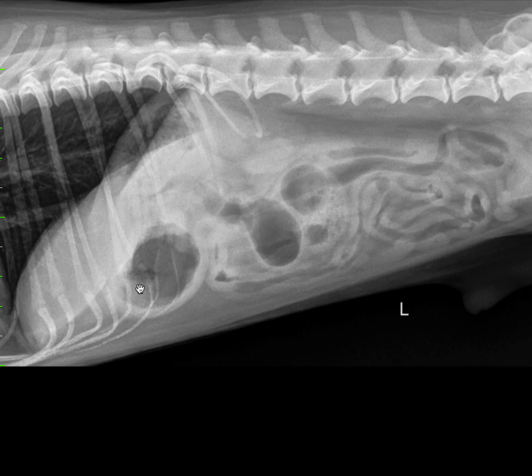I like to assess liver size relative to the position of the costal arch. I'm pointing to the costal arch here. The costal arch is a mineralized structure that joins the ventral aspect or distal aspect of the ribs with the sternum. I say it's mineralized because we can see it on the radiographs in this patient. In young patients, it is often not mineralized, and because it's made of cartilage, it may not be apparent radiographically, presenting as a soft tissue opacity.